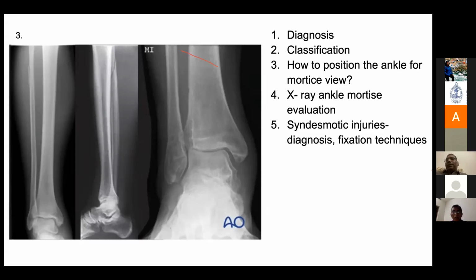Sure, sir. Please. There is a way to go about reading any X-rays, for that matter, for the postgraduates. If you look at both AP and lateral views, you say A, B, C. You look at the alignment: A is for alignment, B is for bone density, and C is for cartilage space. If you go in that order, you will not miss any findings. Just to make a comment on that, that's all, just to read an X-ray. Whenever you read an X-ray, if you take these three things, you will never miss anything. And all the different views also. Yeah. Okay.